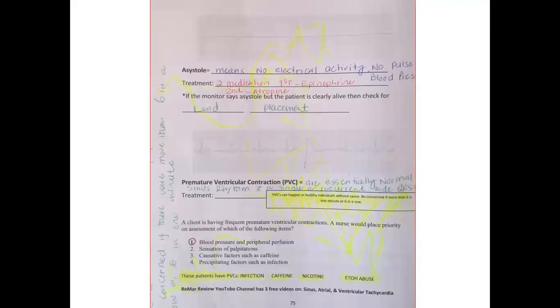And the next picture here is not that good looking in this graph. The top one is called asystole. In this picture, you can see there is no wave at all. It looks flat, nothing, no wave here, right?